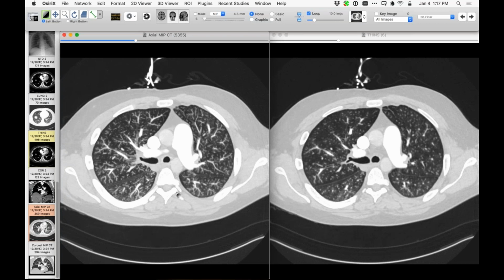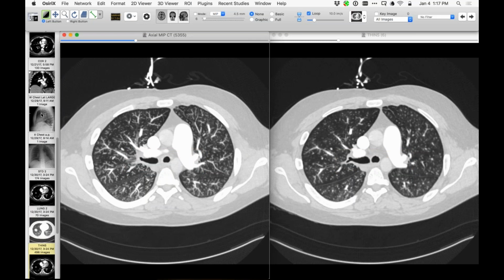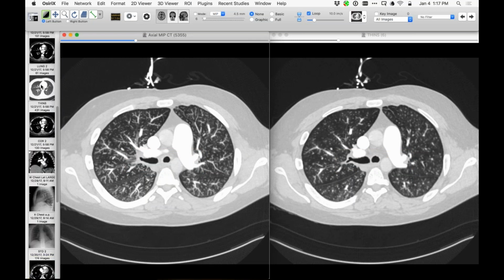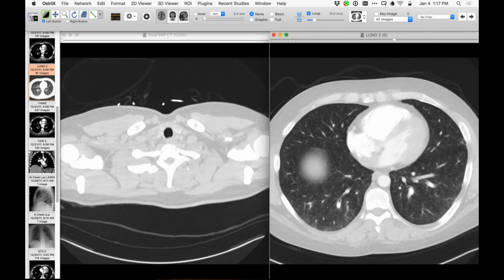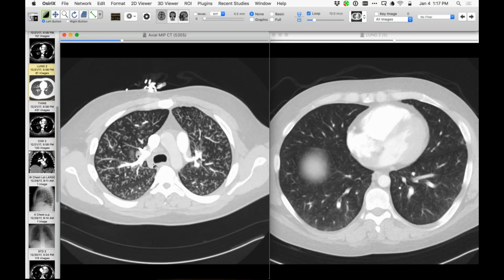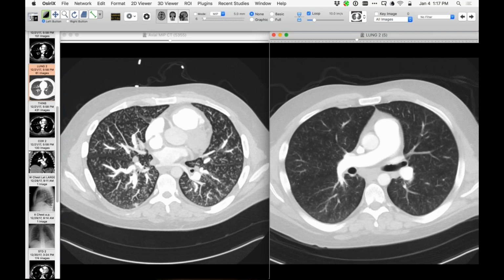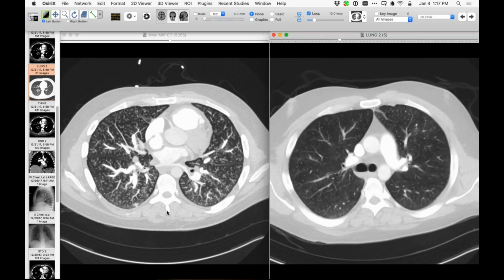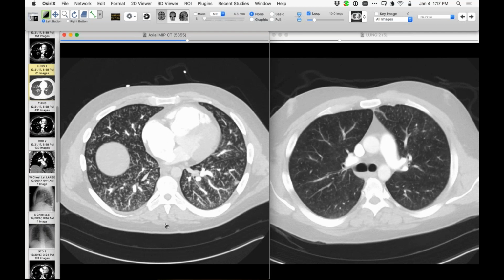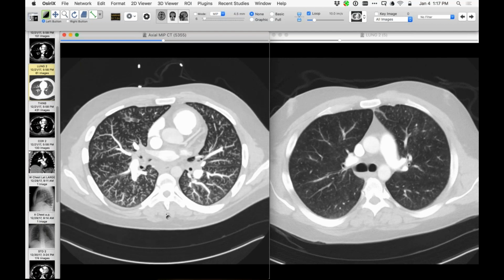What's the interval between the two CT scans now? Just a few days, right? A week? Yeah, this one, previous one was 12/21. Sorry, I got these mixed up. But I don't know if he injected more between the two, or whether that's the granulomatous response to the presence of the material. But it seems he probably re-injected. One would think, isn't it? That's a dramatic worsening. Yeah.